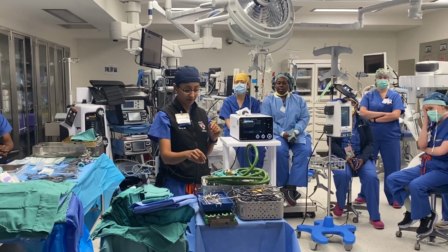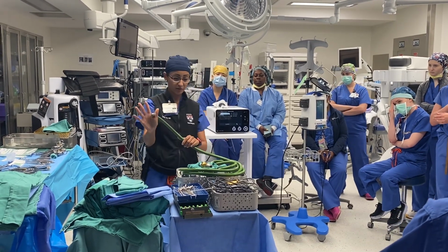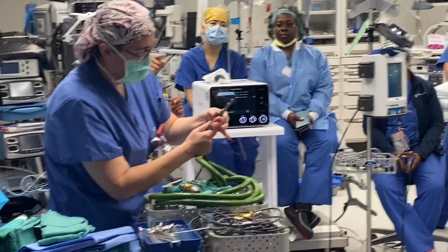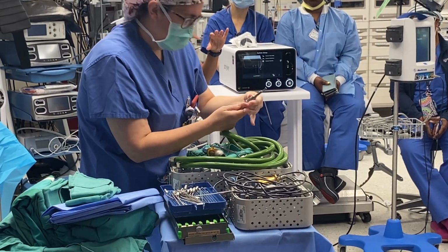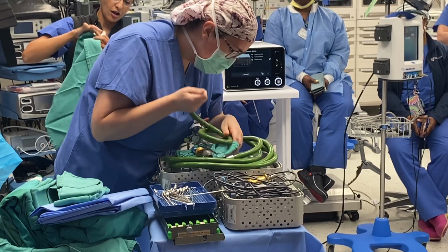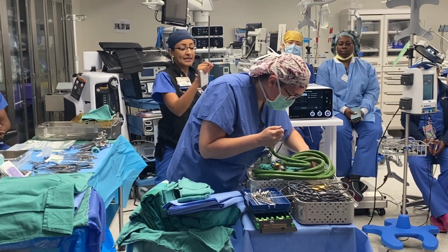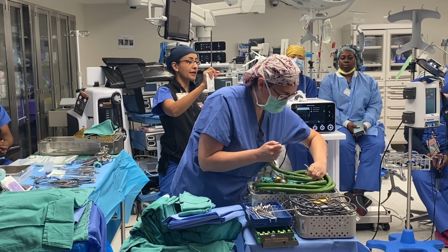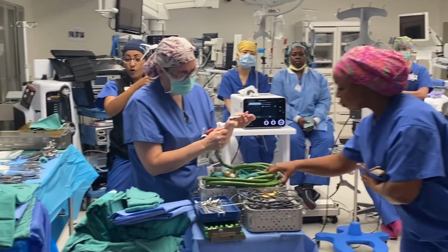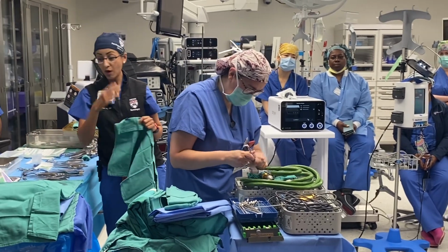And then sometimes you'll hear us ask you for the B1 without the footplate. What that is, basically, this thing comes off. Melissa, you want to? I don't remember which thing it goes on, but basically that L shape goes away, and it's just that drill tip. That drill tip allows us sometimes to drill the skull bone and just make a hole in it. And then you'll see us use tack-up sutures, and what we're doing is connecting. Remember I said the skull and dura are very closely adherent, but when we do the case, we're separating that. So when we want to put that back together, we're sewing with a suture back to those little holes to put that all back together. So that's the B1 without the footplate.